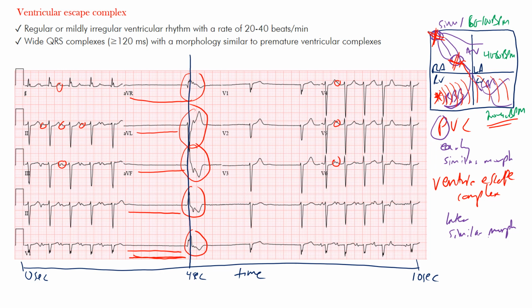So all these complexes are the same, and we use the 12 lead because it gives us the three-dimensional view to get an idea of more than just a single lead. That's why we tend to not just use the rhythm strips, because there's not a whole lot. Sometimes you can get the rhythm, but even then it's better to have everything so you can make a good analysis. Okay, so we were talking about the rate.